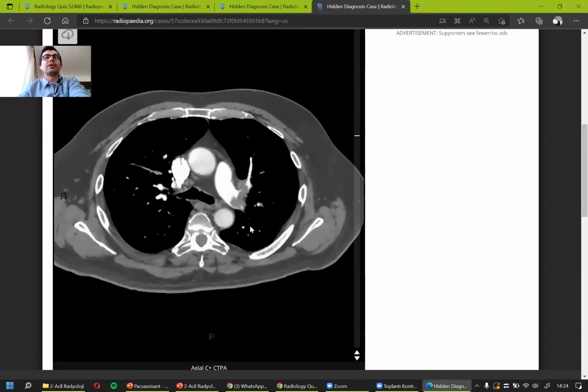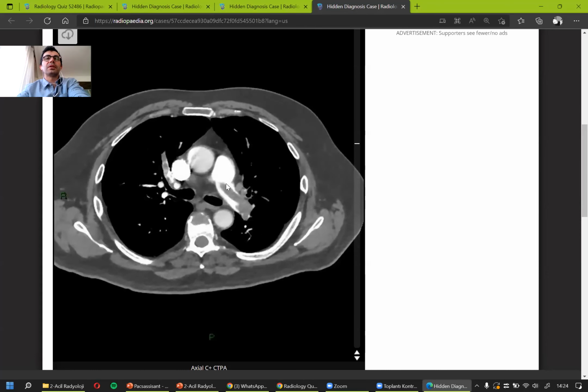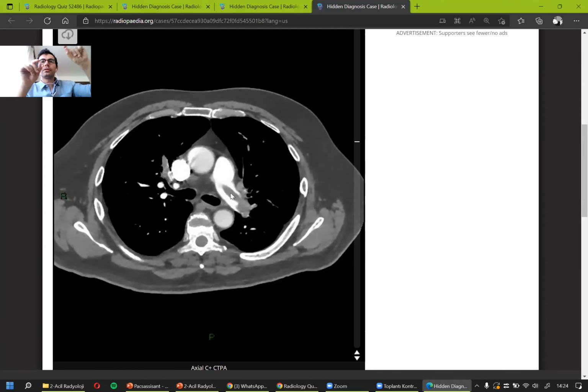I have a question. We are seeing the thrombi, I understand, but when I look at this, it looks like a line, right? Like a pen. It's straight. Can you sort of guess why it is straight? Not like a ball, for example. It is much smaller than the artery itself. It's like a very small line. I think that's the difference between thrombotic and embolic.